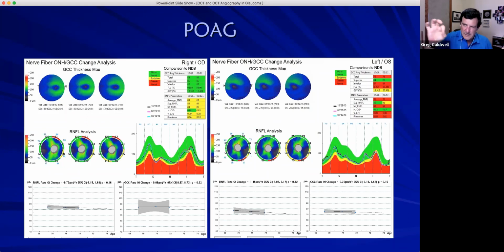And they're kind of looking over to the side, looking at that red or green light. Maybe their eye's moving a little bit. So I usually will judge that if the confidence interval is a little bit tighter in the ganglion cell than over here with the retinal nerve fiber layer, I'd say it's a pretty good scan. There's probably not anything in these scans that's really throwing off some of these measurements when you're doing the progression analysis.